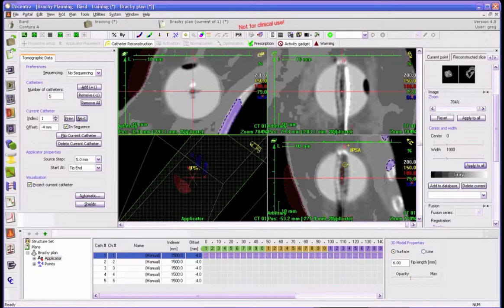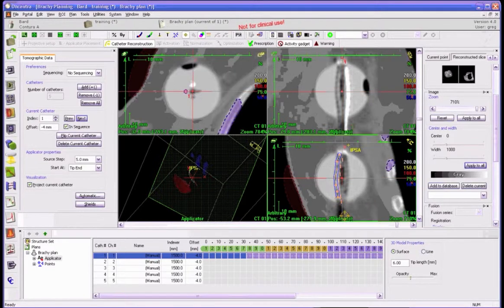So I'm going to start with catheter number 1 here, and that will be right here in this view. Once I make that one current, I have the reconstruction cursor that you're used to seeing, and I want to do that right at the proximal end of that distal marker there. What I want to reconstruct is the air column in this channel, which is just over the top of that marker. So I'll start here, and then I'll just select positions along that air column. I'm going to stop inside the balloon, because we're going to use IPSA, which will automatically do the dwell activation, and we don't want it to activate positions outside here that are in the tissue, even though they are in one of our structures.